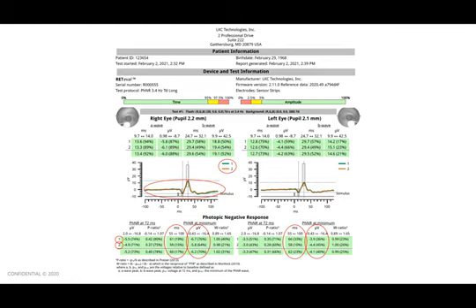I would look at this amplitude over time, and I would see if it was getting worse over time. So measure 1, measure 6 months later. If the amplitude were getting lower over time, that could indicate that things are getting worse with that person's retinal ganglion cells. The last measure I would look at on this report is the W ratio.